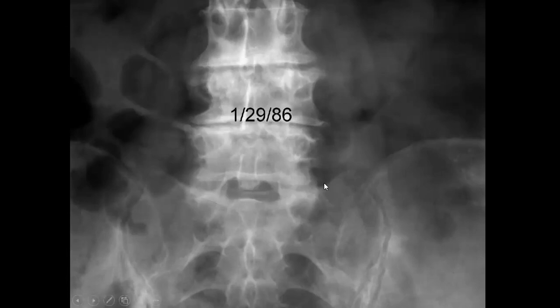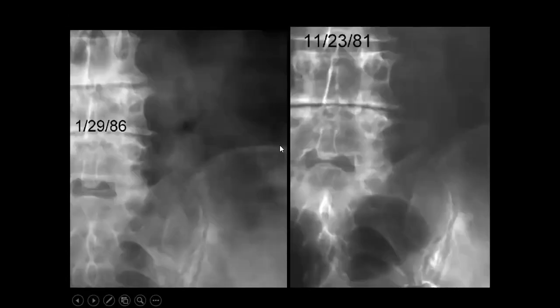Yes, disc space. Sure, it is not just regular degenerative changes, maybe more, right? So you are going to think about septic, maybe. So we give you another clue. Let's have a look and try to figure out what it could be.